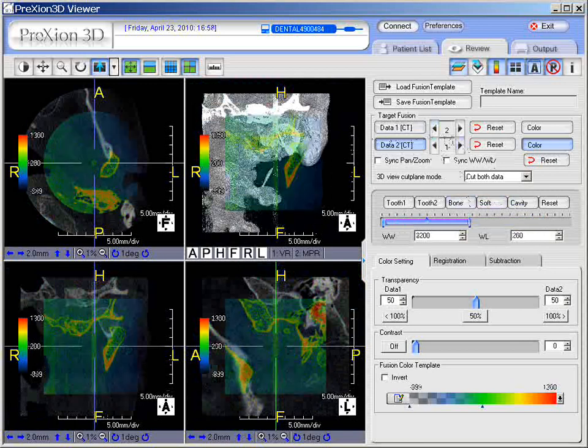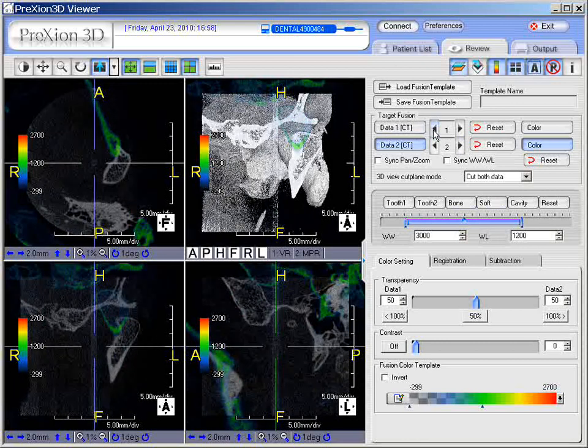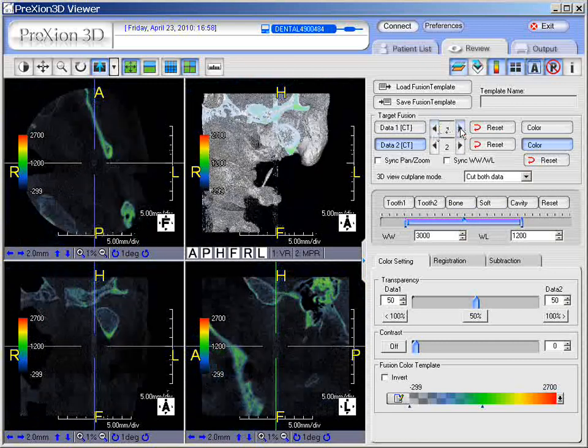Okay, so it's a little more advanced feature, but we do want to point this out. In the future, when you get comfortable with the software, you can perhaps play with this a little bit further, and perhaps you might find some value in it. Maybe it doesn't provide all that much value for you. But anyway, that is checking the Fusion template.